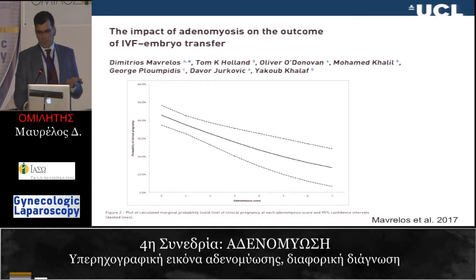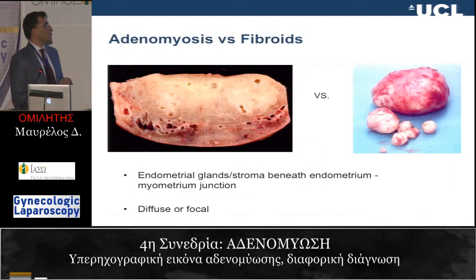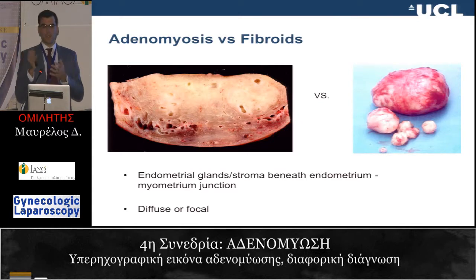Well, there's two. There's fibroids. And the difference between adenomyosis and fibroids is that one condition is diffuse, has no borders. Fibroids are pseudo-encapsulated tumors that have no central vascularity and have limits. So if you're faced with this dilemma, you can try and see whether the pathology you're seeing is focal, has a neat limit, more likely to be a fibroid, or whether it's diffuse, which is more likely to be adenomyosis. I hasten to add, it is not uncommon in a woman who's 40 to have both.